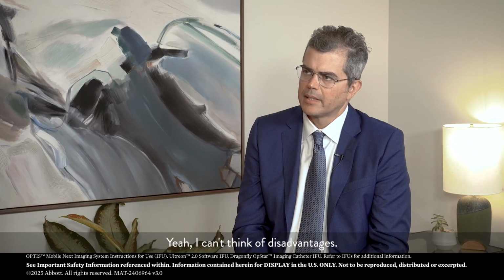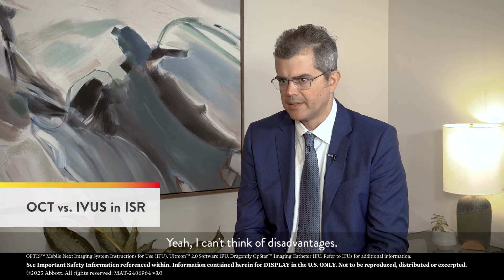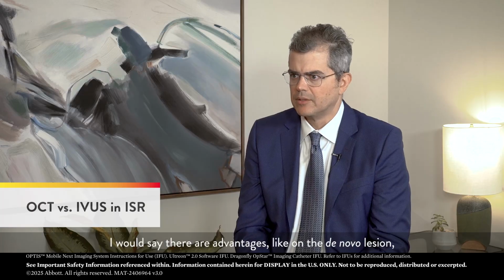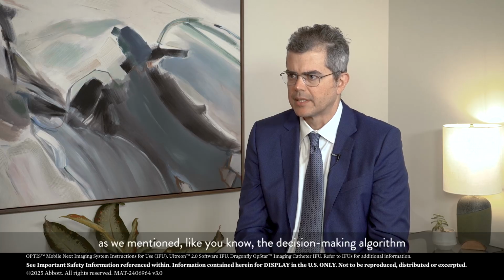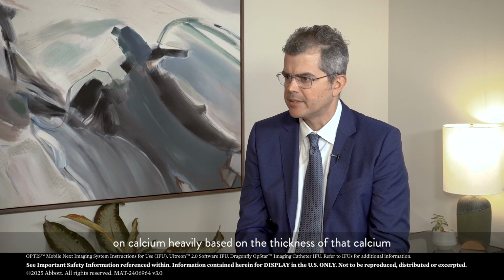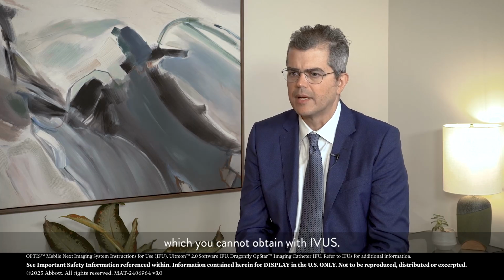Yeah, I can't think of a disadvantage. I would say there are advantages, like in de novo lesions, particularly better tissue characterization. As we mentioned, your decision-making algorithm on calcium is heavily based on the thickness of that calcium, which you cannot obtain with IVUS.